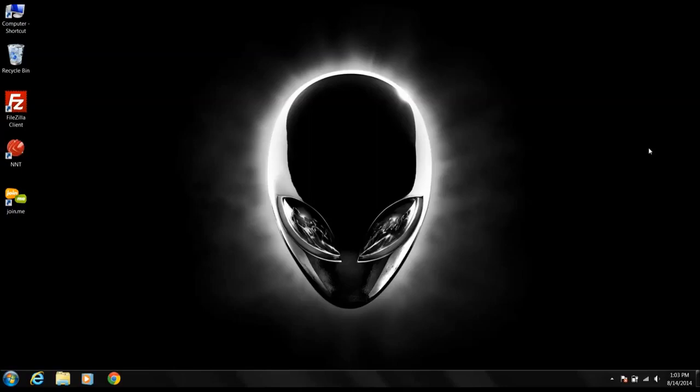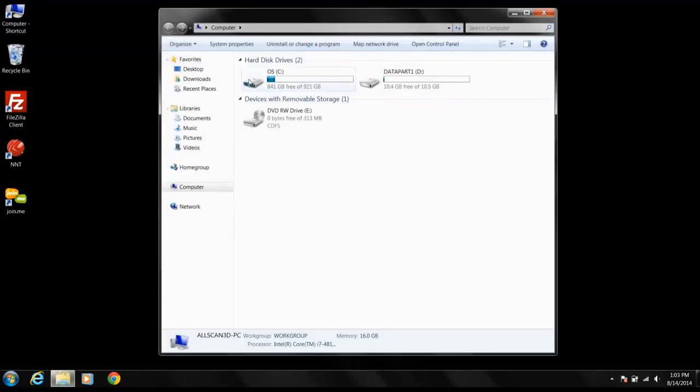The purpose of this video is to show you how to open up your image study and how to use the software tools within your NNT viewer. So start by inserting the disk into your DVD drive, and going to your computer icon, you'll find your patient's name with the date, and double click.